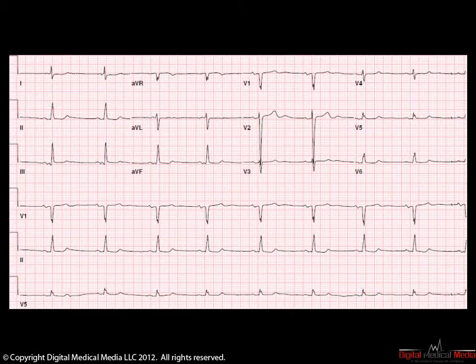The presence of a U wave is not necessarily pathologic, and is generally only commented on in the interpretation of the 12-lead. The typical reading for a 12-lead such as this would be prominent U waves. Remember, however, that hypokalemia can cause the appearance of a U wave that was not previously present.